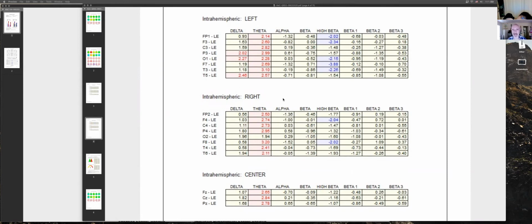The drag is the places where you're only running average or a little above average or below average. But that's not normal for you. You aren't zero. You're probably more like 0.5 or 0.7 or 0.8. Once you release these negatives, it'll come together. I want the number across the whole column to be within 0.5. And you're like 2. Wow. There's a 1.5 standard deviation spread, and the whole range is dragging down.